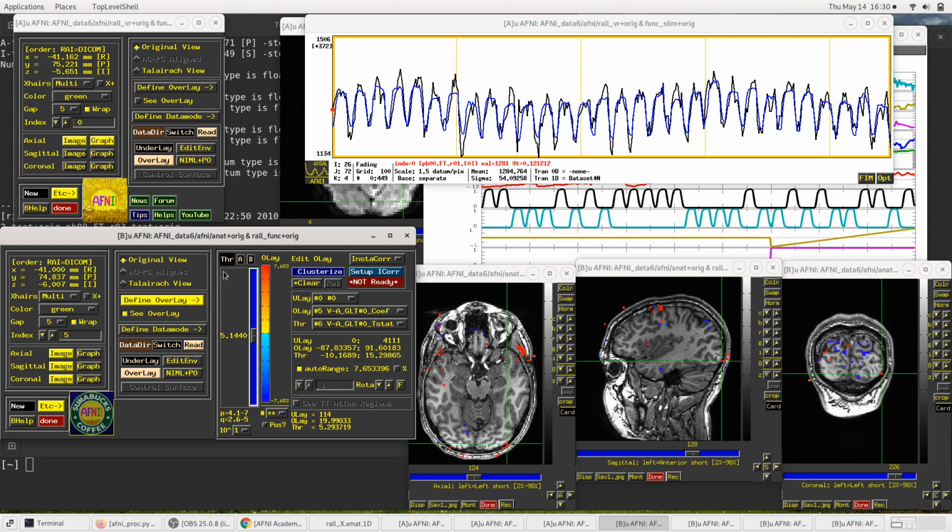If we come up to THR here, I can right click, and now we can specify a p-value, a q-value. So we can type one in if you wanted to type in a p-value of 0.000162, whatever, and set. Or you can just be quick, and there's a separate command to just set p equal 0.001, and there you have it. So this is fine. We'll use p equals 0.001 for this example then.